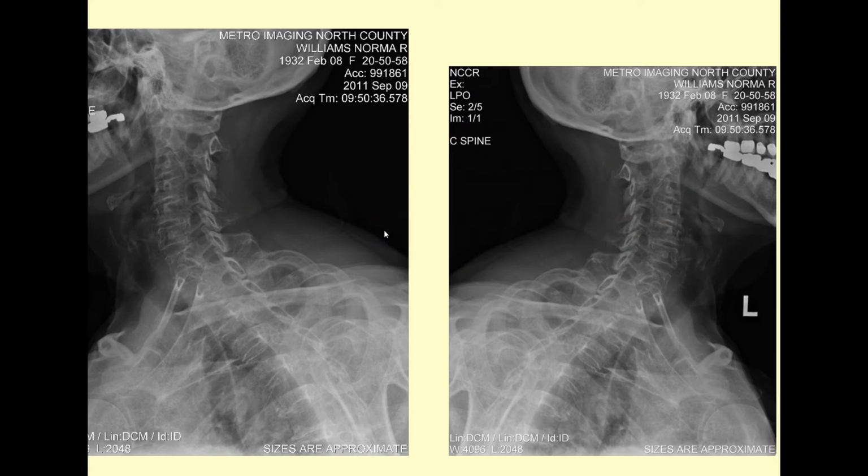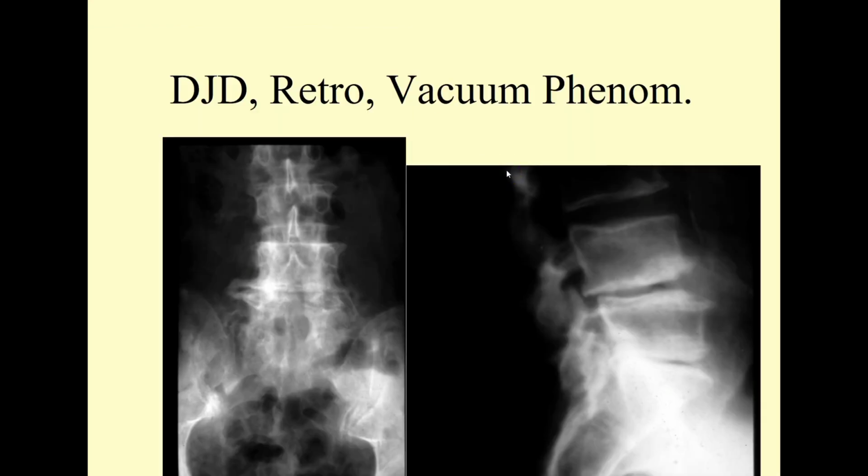So that's the story I would suggest that you tell your patients as you review images with them, because if you're going to do follow-up imaging a couple weeks from now, and the patient is really 100% improved as far as their neurologic complaint, you still are going to be showing them essentially identical radiographs, and that sometimes weakens the doctor-patient relationship. Now, jumping down to the lumbar spine, here we have a couple of classic presentations.